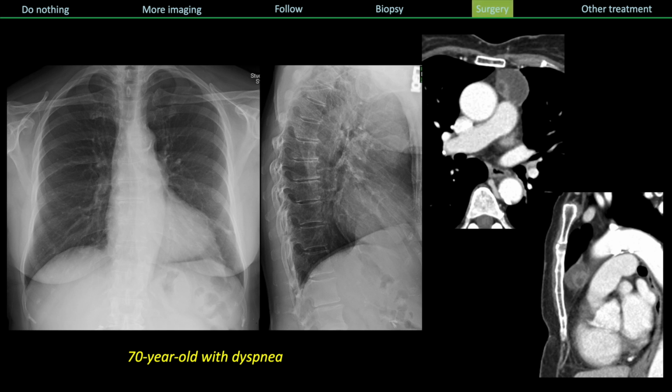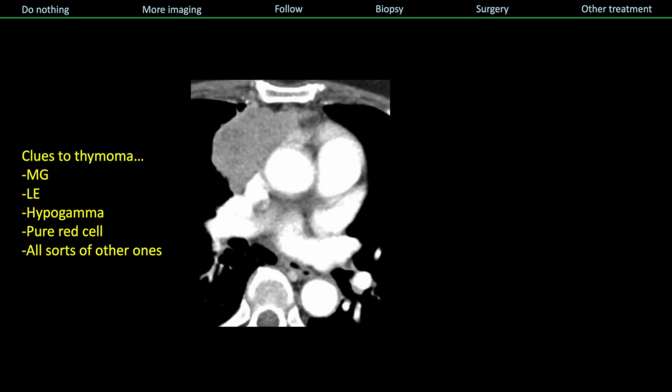This type of lesion can go directly to surgery. No aggressive features, incidentally discovered. Soft tissue or soft tissue with fluid, particularly in an older patient. Pretty high confident diagnosis in this case.